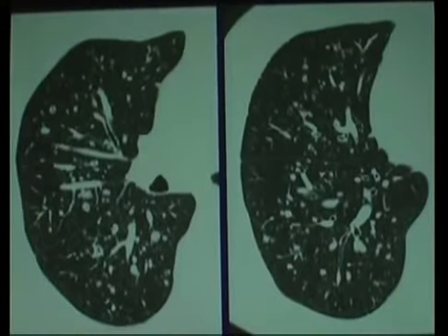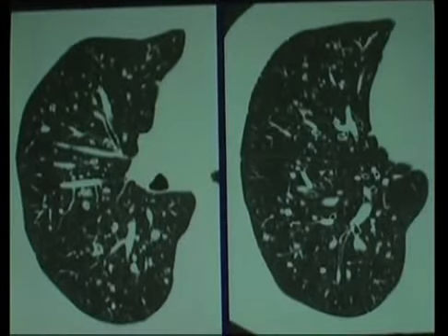You can occasionally see these little donut signs, and this is somebody who has diffuse alveolar cell carcinoma. So if you see these, these are not airways. These are obviously nodules. They're in a random distribution. And if you see kind of like these little cavitary changes in them, think in terms of bronchoalveolar cell carcinoma. So these are, I'm just kind of finishing off the edge, if you will, polishing the subject. But these are all rare entities, and I wouldn't worry about them.